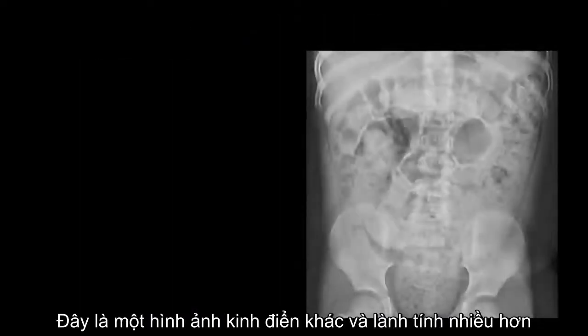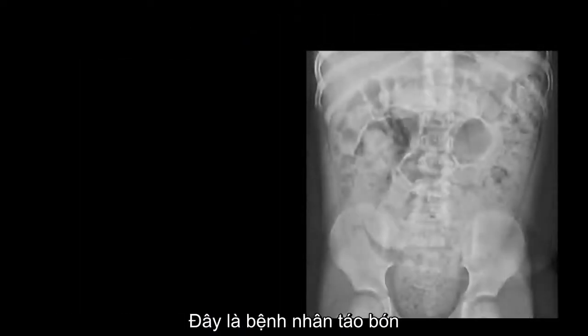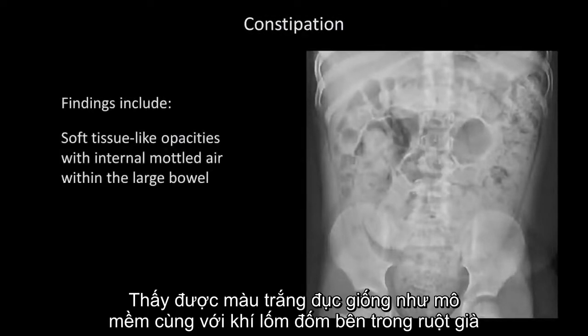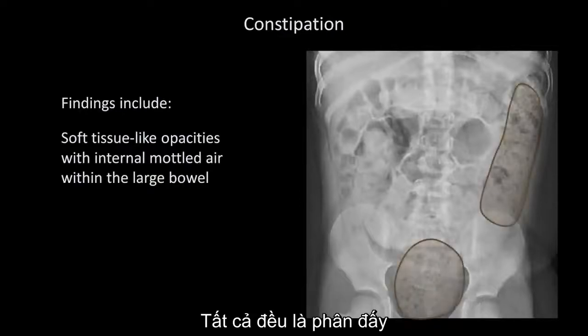Here is another classic and much more benign finding. This is a patient with constipation. We see soft tissue-like opacities with internal mottled air within the large bowel. That is all feces.